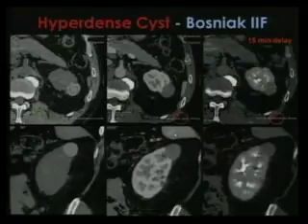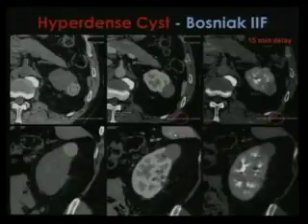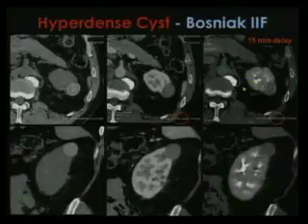Talking about pseudotumors or lesions simulating a solid mass, we have the hyperdense cyst. Look at that. We have the pre-contrast phase, first column, corticomedullary and delayed phase. In these phases, we measure the density of the lesion.